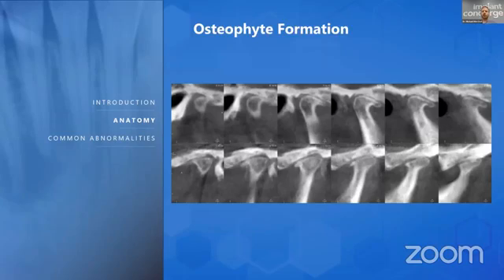And so here's another example. You hear the term quite often, oh, there's beaking of the anterior surface. It's not a term that we like to use, but that's what it looks like. It does look like a bird. But look how there's no space for that articular disc. So the disc is either displaced anterior or posterior. In this example, most likely it's displaced posteriorly, because where else would the disc be at this point?